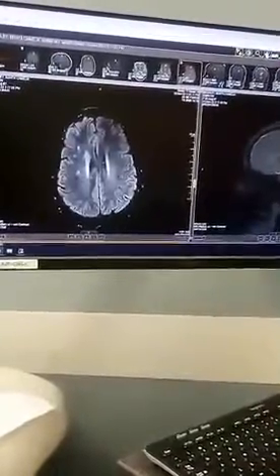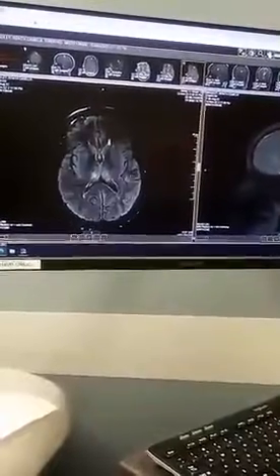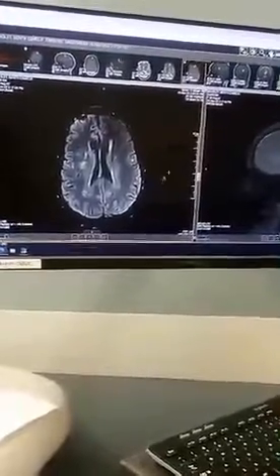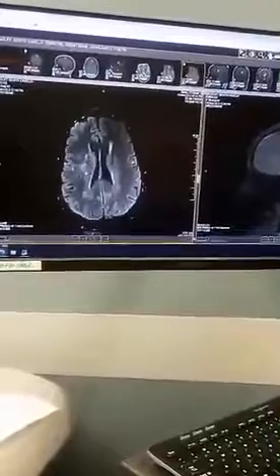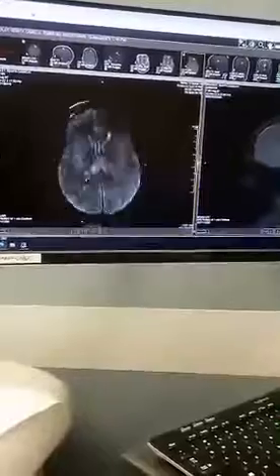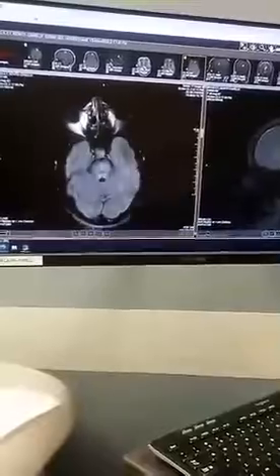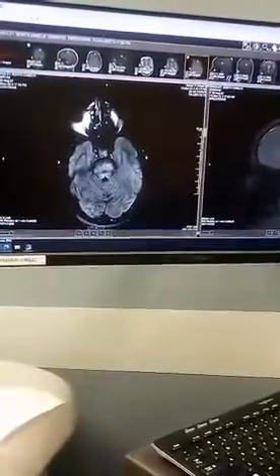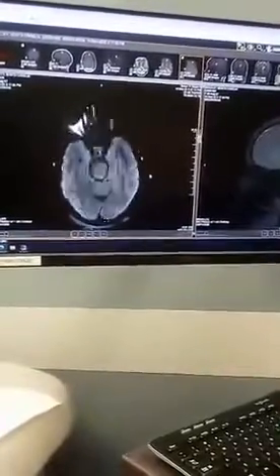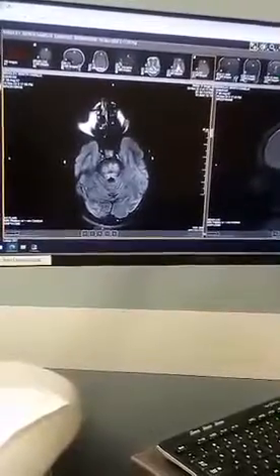What we call atherosclerotic changes, small vessel ischemic white matter changes, and you've got a little of them scattered around. If you notice, although there is some on the left side of the brain, this is left, this is right. There's clearly a lot more areas on the right side, including down here in the pons. See all that? That's all area that was damaged? Yeah, that's what it looks like. Can it be reversed? No, but you're doing okay right now.